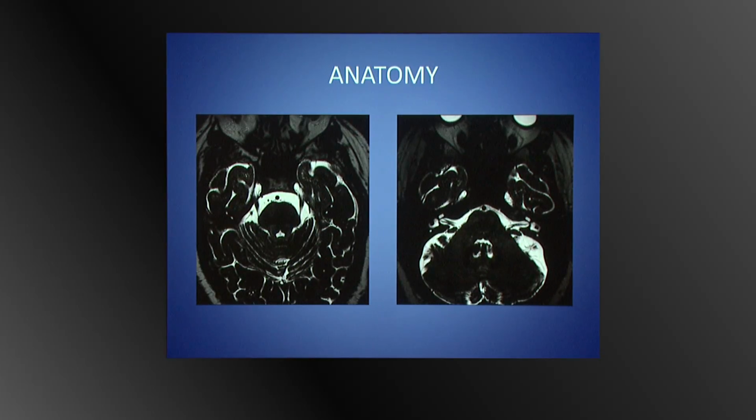And so the important relations, by far the most important, are the neurovascular structures, which include cranial nerve 5, and you can see it crosses the Petrous apex to enter Meckel's cave where it divides into its branches. More medially, and I hope it projects, the 6th nerve, you can see just entering Dorello's canal, and posterior inferior 7th and 8th nerves, less involved by Petrous apex lesions, but occasionally can be.